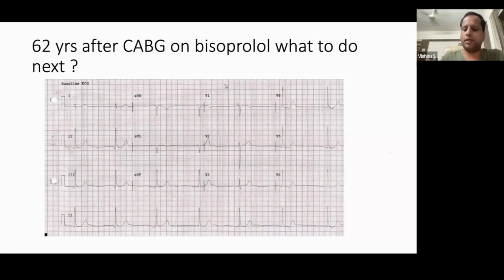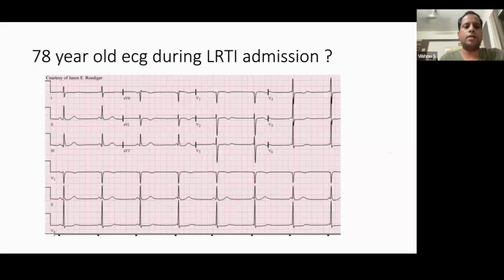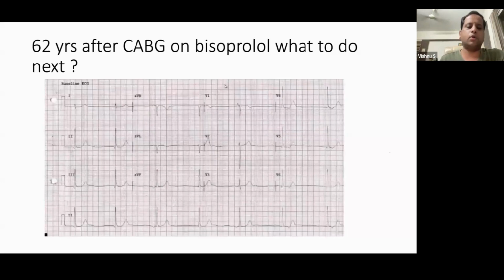This patient, we actually made him walk, and his ECG sinus rhythm took over and his rate increased. So these kinds of conduction system problems, like increased vagotonia, we can see with suppressed SA nodal activity due to beta blocker. So just make the patient do treadmill testing or just make him walk or stand, and then take an ECG.